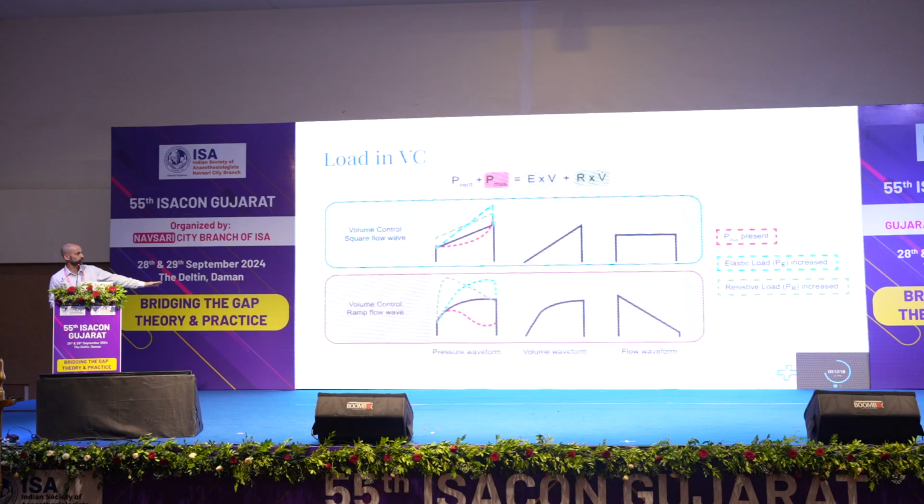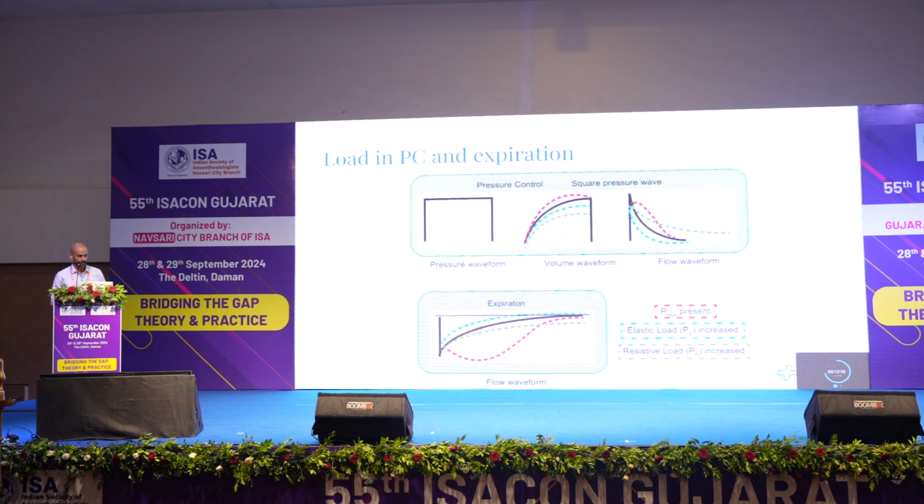Similarly, if you are in volume control and ramp, your waveforms will look as on the bottom part of the same slide. Now, if you are in pressure control, don't look at the pressure time much. Look at the flow time. So the flow time will change according to this graph. Last image here in this corner, this is your flow time.